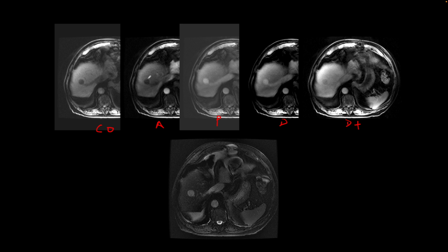So this lesion near the dome of the liver does not show any arterial phase enhancement, shows enhancement and almost like a communication with one of the hepatic veins draining into the IVC, and the enhancement pattern is similar on all the sequences. So there was no good image to show its communication with a portal venous branch, and so this is a vascular abnormality where a shunt has developed from a branch of the portal vein, and it's now draining into a branch of the hepatic vein and into the IVC. So it's a portosystemic shunt.